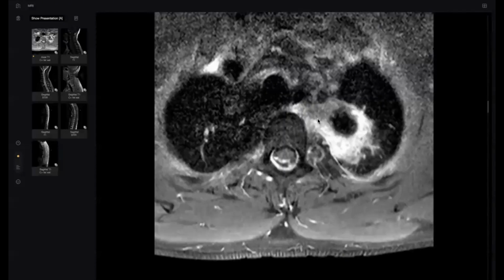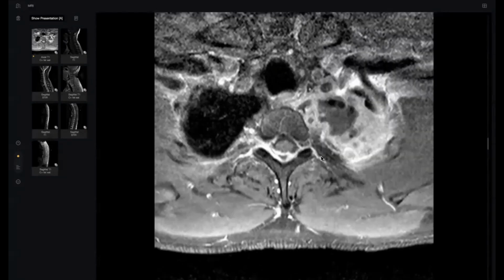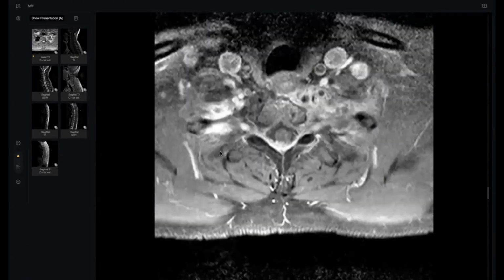Look here carefully, my colleagues. See, there is osteomyelitis of this costovertebral joint, and then see, there is some extension here and here bilaterally, and this is very obvious: spread of the infection through the neural foramen, and then the cord is swollen.